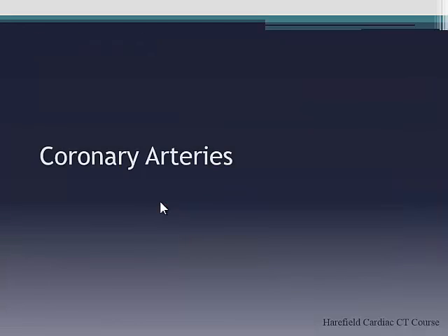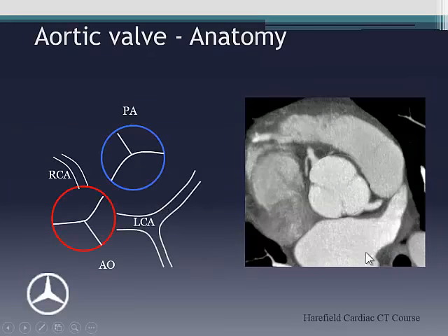Okay, moving on to coronary arteries, finally. Okay, so we've already said when you've done a double oblique view, you should get the pulmonary valve as the most anterior valve, and there's your right coronary. Now, normally, you get the interatrial septum here, yeah? So interatrial septum, you know from echo, for those of you who do echo, will always abut the non-coronary cusp, okay, or the non-coronary sinus. So in this case, we know that the anterior chest wall is here. The most anterior sinus is going to be the right coronary sinus, and surprise, surprise, it gives rise to the right coronary artery.